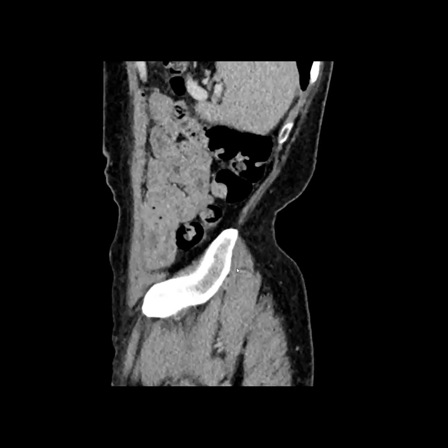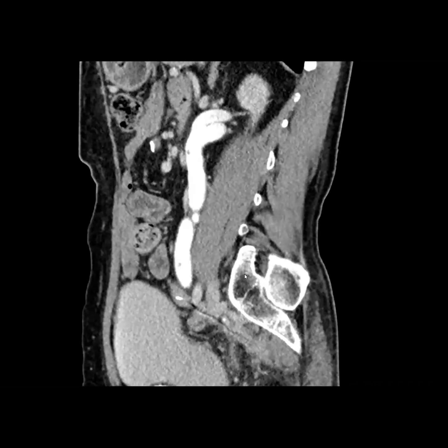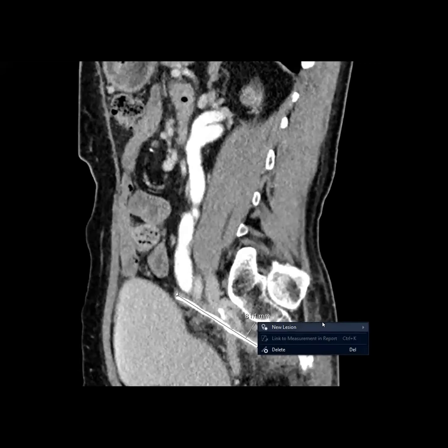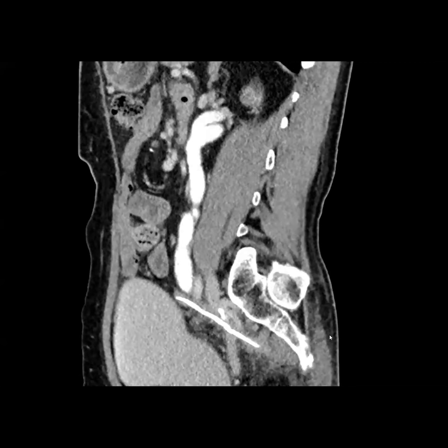Sorry, it's being a little slow. Okay, so here's my ureter. Yeah, what is that thing? Exactly. Initially, I was like, is that a clip?